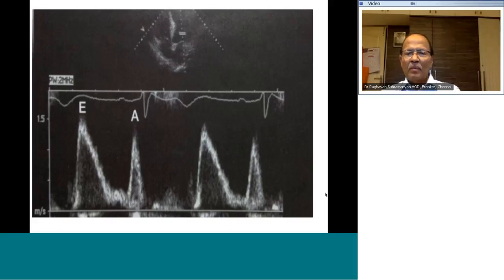Now, this is also a spectral Doppler recording across the mitral valve from the apical window. This is the normal pattern. It shows velocities of less than 1.5 meters per second. It shows a sharp decrease in velocity in mid diastole, and then again filling of the left ventricle during late diastole because the atrium contracts. The interesting finding is that the border is very clear and opaque, whereas the center is relatively clear. This is what is called laminar flow, or the normal pattern of flow.